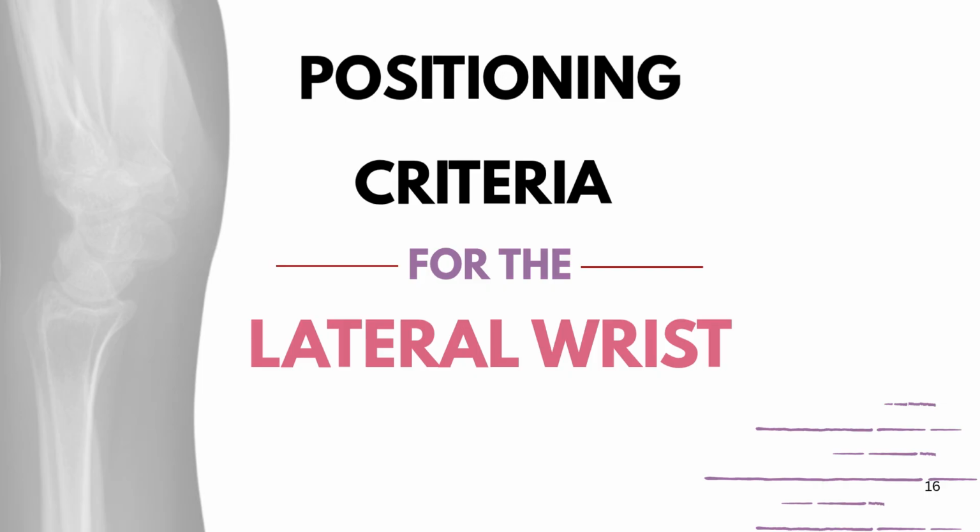Next, I will discuss the positioning criteria for a lateral wrist projection. These criteria are used to evaluate whether the radiograph has been positioned correctly and is suitable for diagnostic interpretation. Several anatomical landmarks and image characteristics will be assessed to confirm a true lateral wrist position.